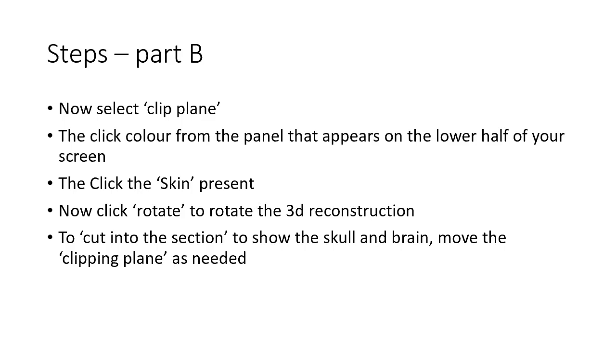I think this is the first time that I played with this, and I can see how this could be useful. Obviously, the 3D software in the neuro navigation systems, either in the Stealth Station or in the Brain Lab, are more advanced than this, but I think it's still useful to have this in the PACS, to get a 3D visualization of the lesion in relation to the external markers.